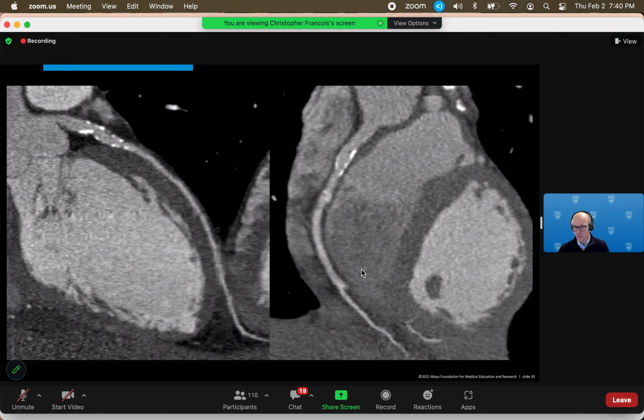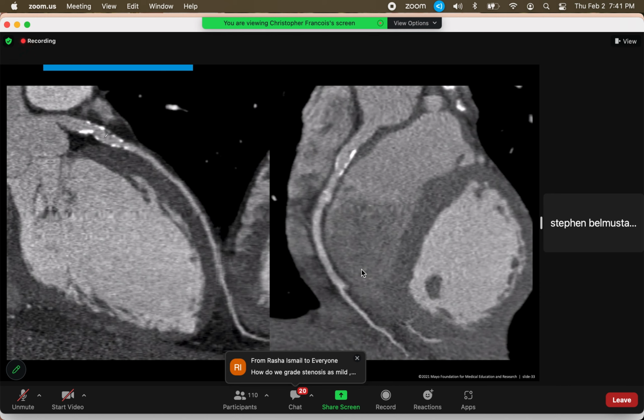What do you think the cause of the coronary artery aneurysms is in this case? Could it be like Kawasaki's? Okay. What else? Now, what's the typical demographic of a patient with Kawasaki's disease? They're usually children, younger. Yeah, exactly. Now, this is a 65-year-old. Okay. So maybe another type of vasculitis.